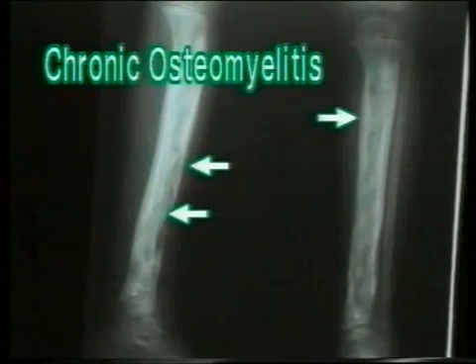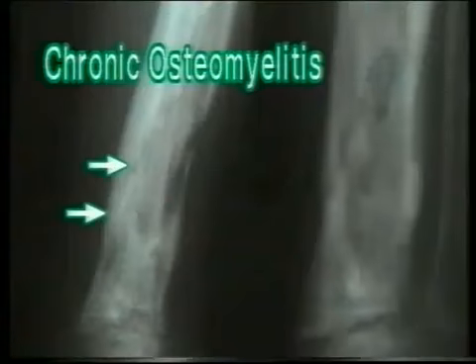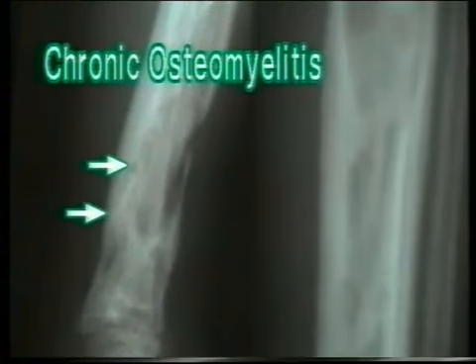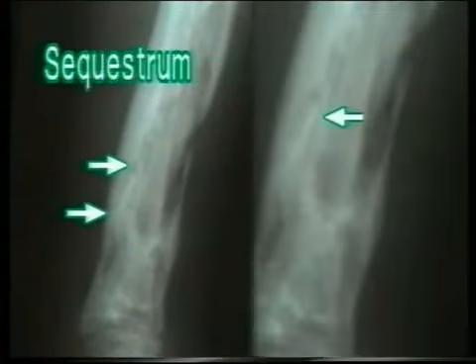In this X-ray, almost the whole length of the tibia is infected and shows multiple osteolytic areas. Note the osteolytic areas in the close-up view on the right side. The arrow on the left points to a dense radio-opaque streak, which is the sequestrum. Sequestrum is a densely radio-opaque shadow of a dead piece of bone surrounded by a radiolucent zone which is occupied by the pus and exudate.